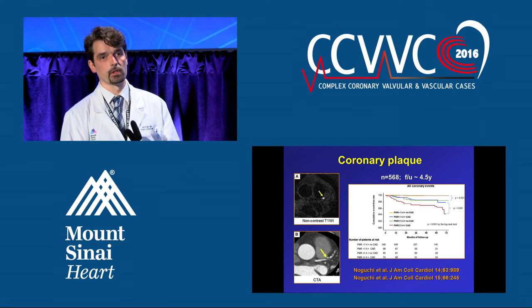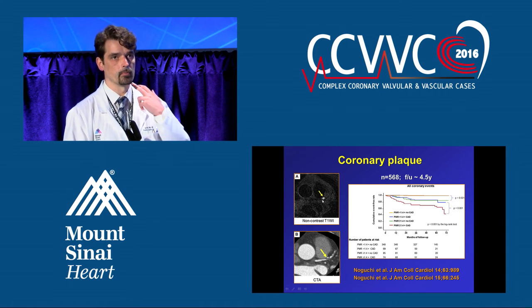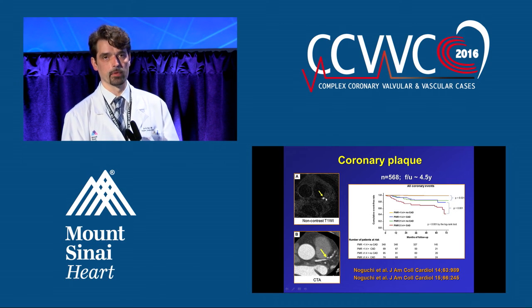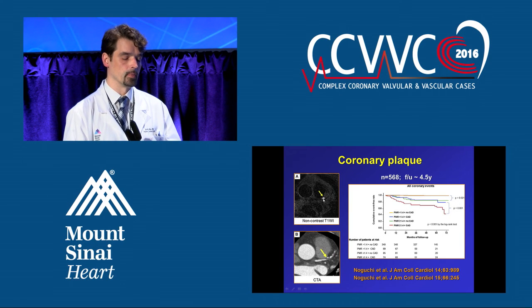Now, the main limitation of ultrasound and of MRI for you is that they are not done in the coronary arteries, non-invasively. And there's some data with MRI, I'm presenting it here. This is a technique similar to the one that we use to look at plaque bleeding in the carotid, but it's done in the coronary arteries. And this is the corresponding CT image where you can see a plaque here. Now, the bright in the CTA is calcification, but in MRI, the calcium looks dark. So this bright thing is something else. Because of the evidence that we have from the carotids, we believe this is probably intraplaque hemorrhage also, but this is not completely validated yet.